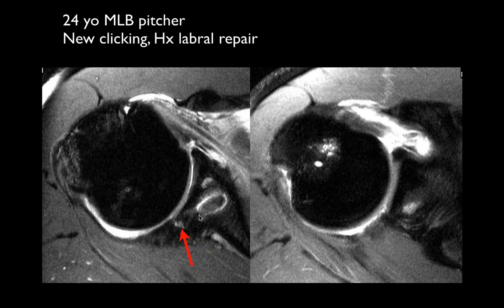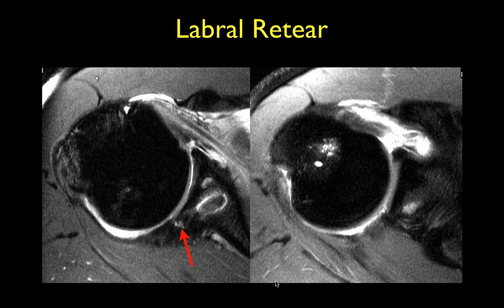Well, wait. Now we're high. We're way up high here. The labral injuries for instability tend to be lower, and what we have here is an old Hill-Sachs impact, right? And this is actually the glenoid here. It's a retroverted glenoid, and this is one of the congenital anomalies we talked about, where the glenoid was insufficient. In development, the body created a very large posterior labrum.